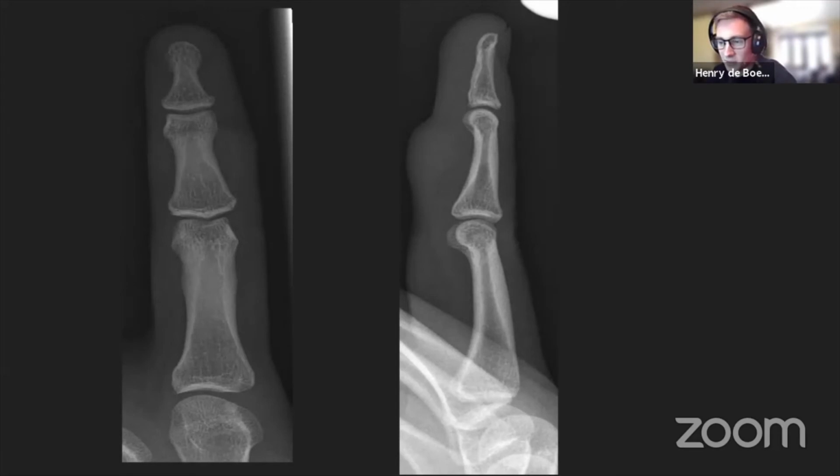Okay, yeah, Anna, well done. I'm glad you spotted the soft tissue swelling. But do you think there's a fracture or not? Yeah, so looking through this one together, the bone cortices and the alignment look normal. Yeah, no fracture, but there is soft tissue swelling here.